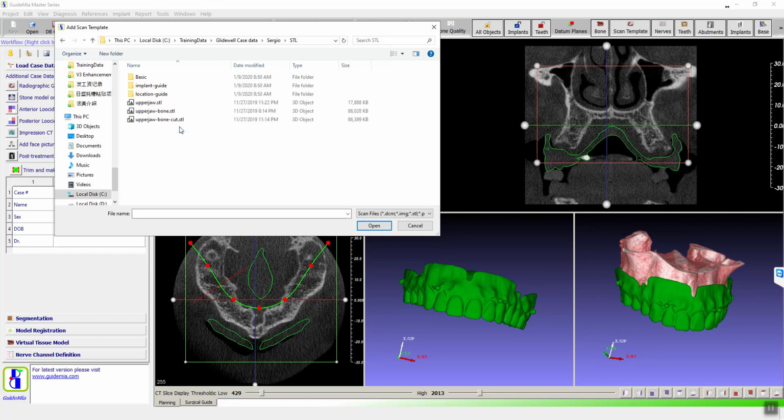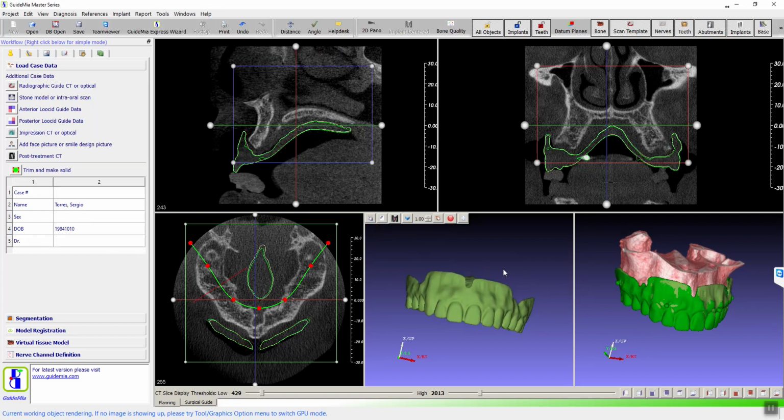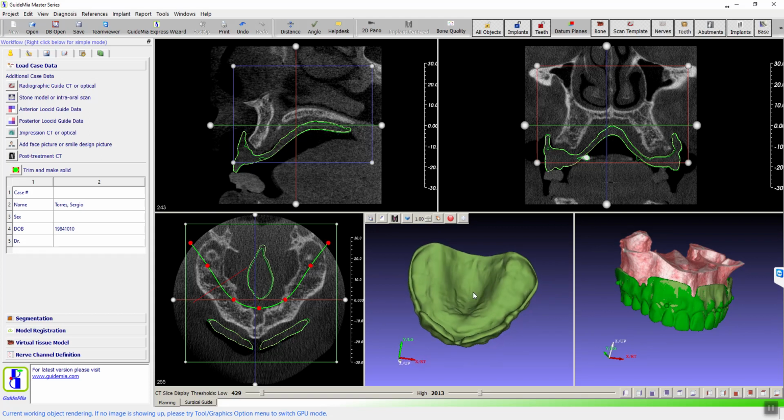We're all confused what STL file you have. Is this from you or actually my guy? Take a look. I don't remember. Is that from my guy? That looks nice, but we didn't make an intraoral scan of it. Okay, so I guess my guy made it.